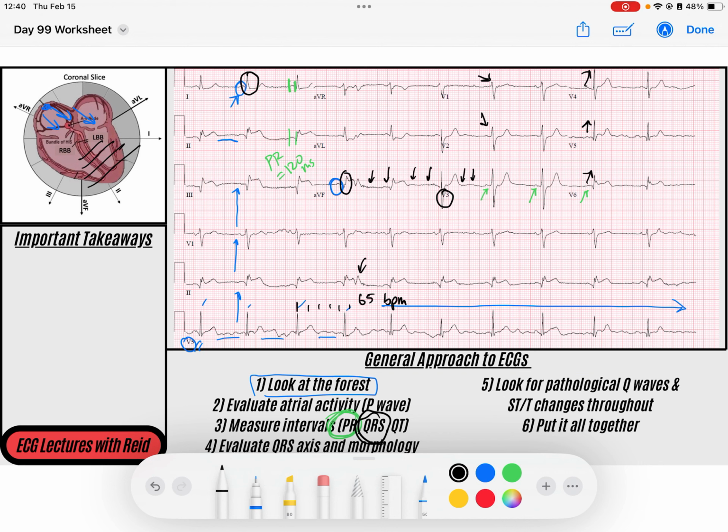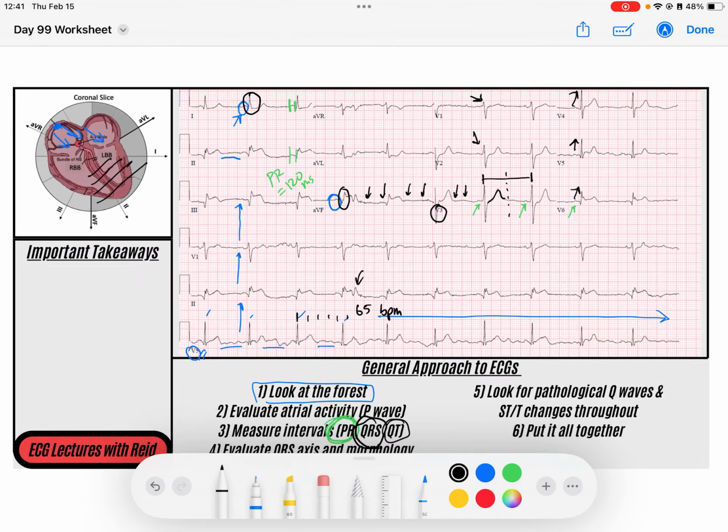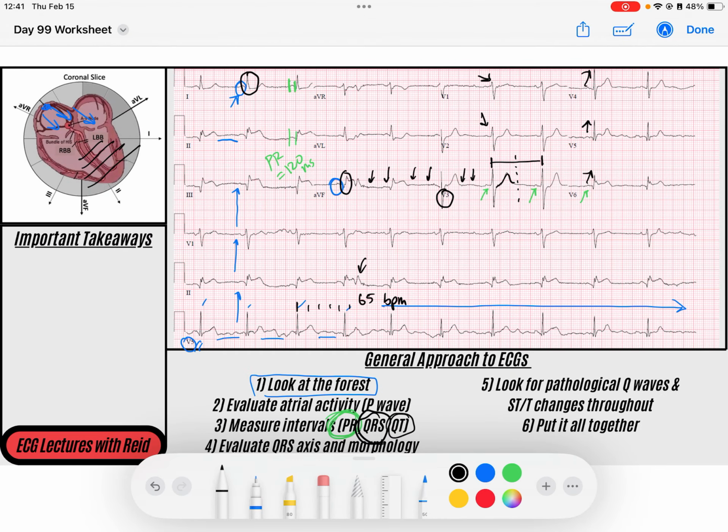during the precordial progression. My QT interval, I like to eyeball that by finding an R to R interval, maybe like this right here. And if you measure the midway point between the R to R, you should notice that the T wave should end at least by that point. And so I would say the QT interval in this patient is normal.